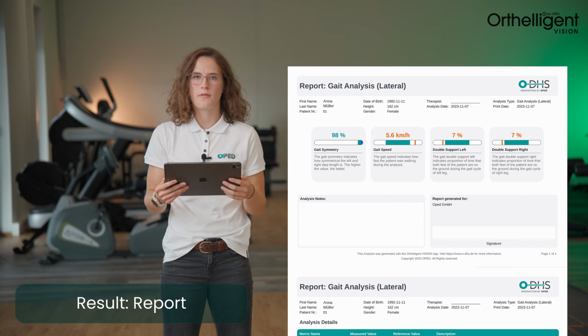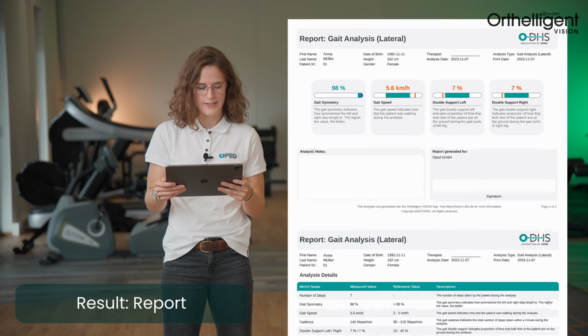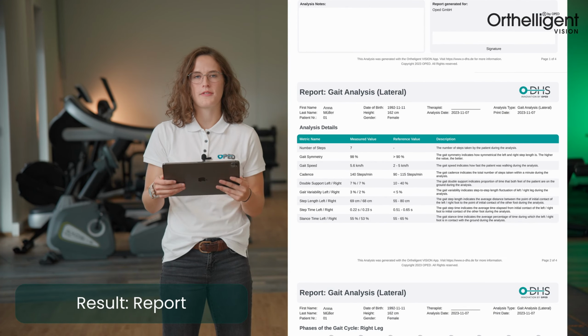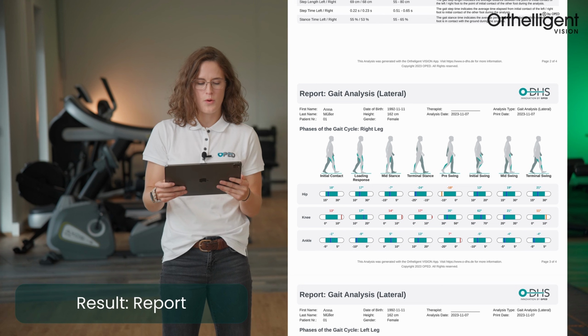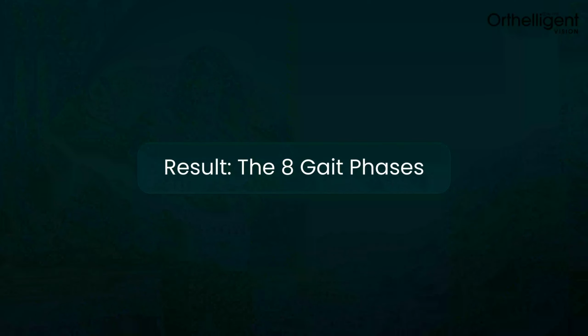In the top you have some information about your patient, and onwards you have the quick results. Following you have some more parameters which are also described. On the next page we have a special analysis which divides the gait into the gait phases.